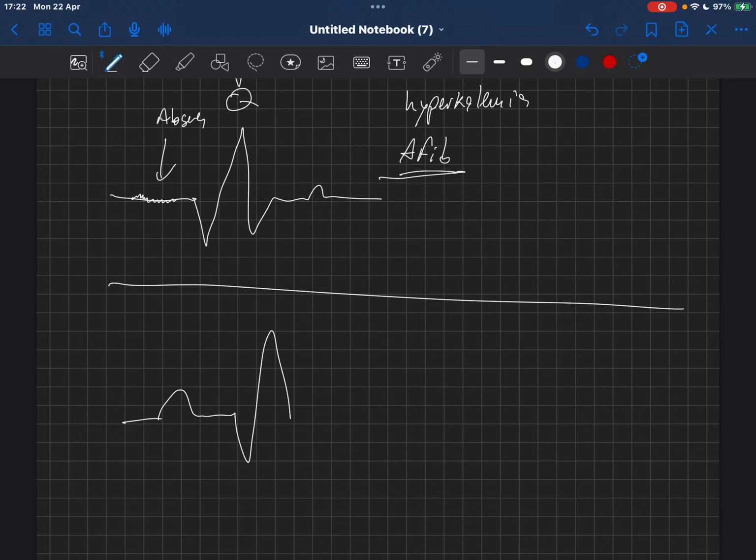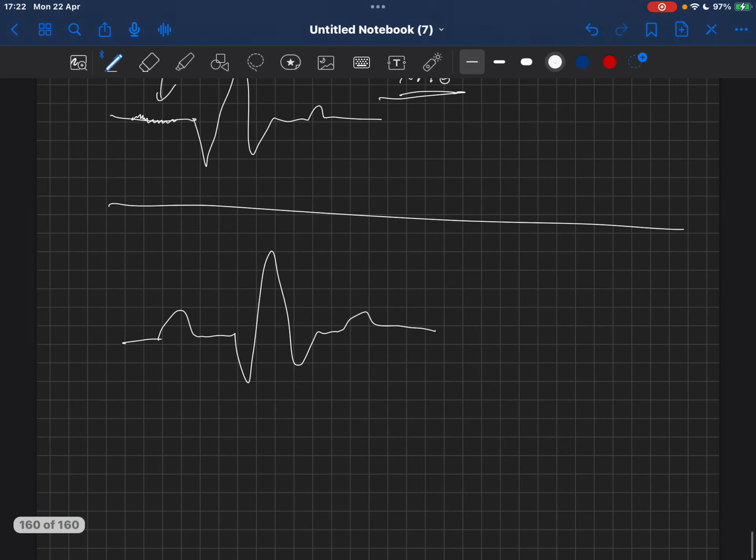Okay, so we played some with the ECG. I played with it and explained some of the pathologies, mainly in order to show you the P, Q, R, S, T, and the intervals, so that you can remember this. So this is a basic ECG, but mainly about the waves, the complexes and the intervals.